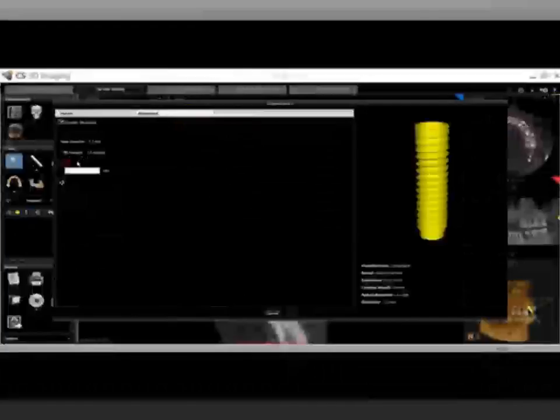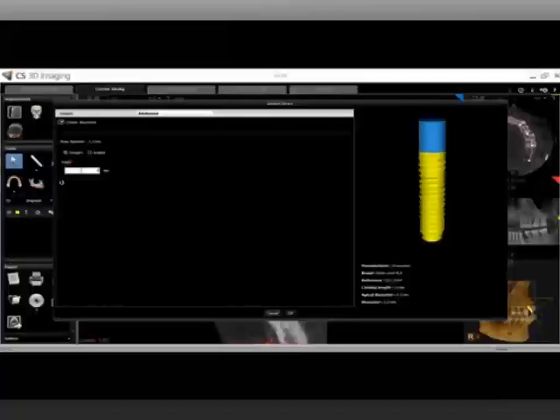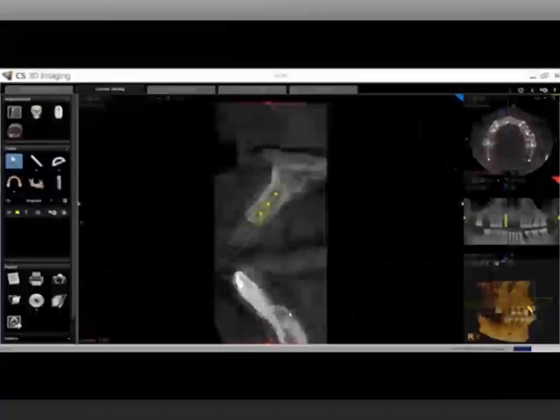If you hover your mouse over the height box, you will see that the abutment must be between 0.01 millimeters and 20 millimeters. In this case, we will add an abutment height of 4 millimeters, and you can see this instantly reflected in the 3D virtualization. Click OK and the abutment is placed at the occlusal of the implant before the restorative space.